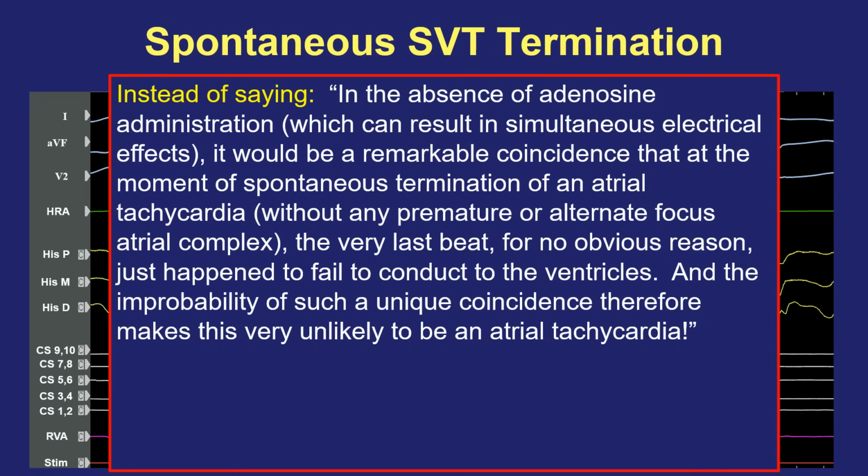But you'd have to describe this phenomenon by saying, in the absence of adenosine administration, which could result in simultaneous electrical effects, it would be a remarkable coincidence that at the moment of spontaneous termination of an atrial tachycardia, without a premature or alternate focus atrial complex, the very last beat for no reason happened to also fail to conduct to the ventricles. And the improbability of that unique coincidence makes this very unlikely to be an atrial tachycardia. That's how you would explain this phenomenon.